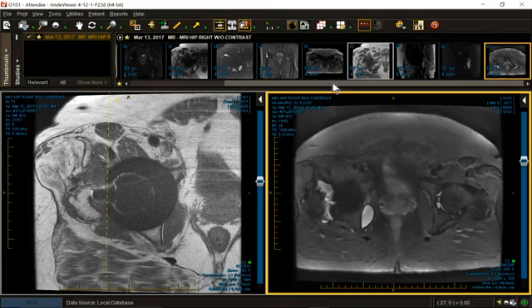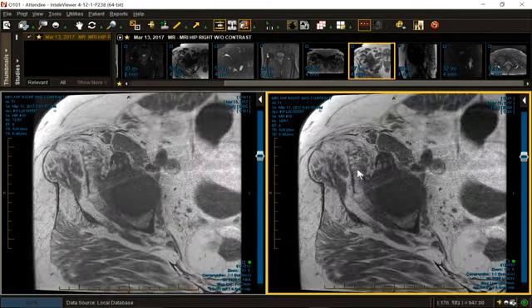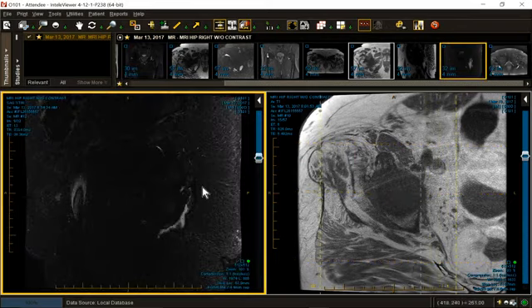So admittedly, it's an awful-looking thing. Let's go back to these muscles and the coronal projection. We've already established we've got particle disease. Let's look at our sagittal.